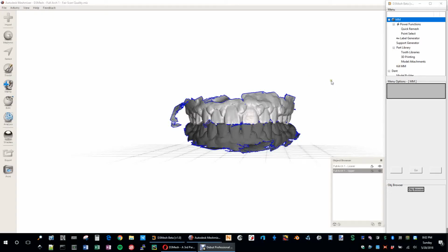Okay, so this video is a continuation of more demonstration on how to use the Model Builder module within D3Mesh.